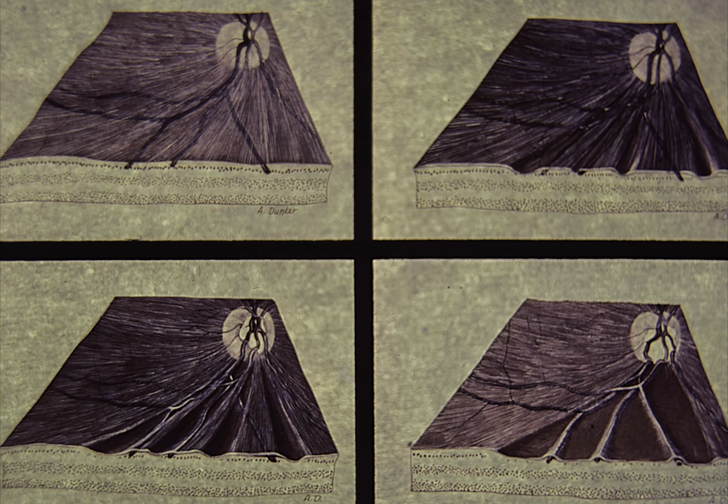Upper left. A schematic drawing shows that the normal peripapillary retinal nerve fiber layer has fine, radially oriented striations that partially obscure the retinal vessels. Upper right, after focal axonal loss, slits or grooves appear in the peripapillary arcuate zones that represent thinned or absent nerve fiber tissue. These areas are best seen 1 to 2 disc diameters away from the optic disc using red-free illumination.